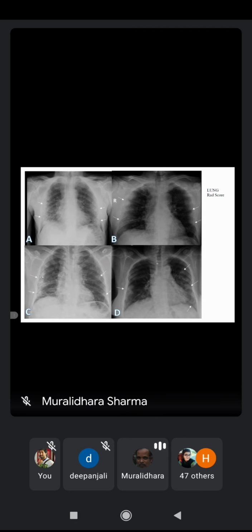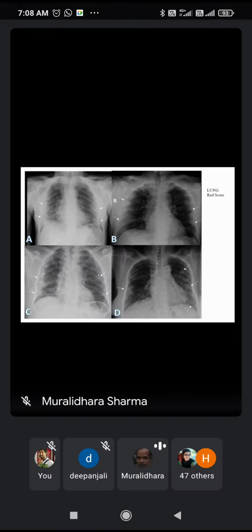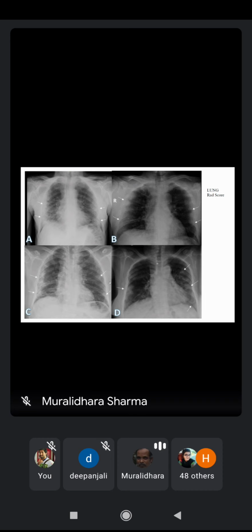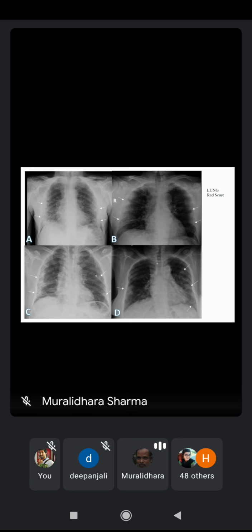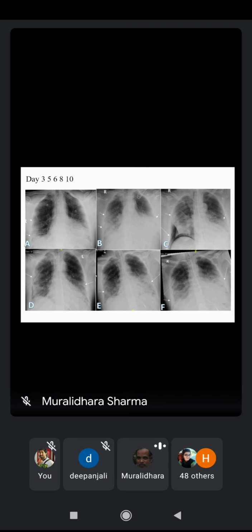Whereas in this X-ray, the involvement is quite significant. Air entry is markedly lesser in the right middle lobe. So you may give 3 and then 2, 3 to 5, and then 2 plus 2 could be 9 or maybe 8 scores. That's how the scoring is done. So the method of scoring is simply by studying the extent of involvement and the area as such. That's how the scoring is done.